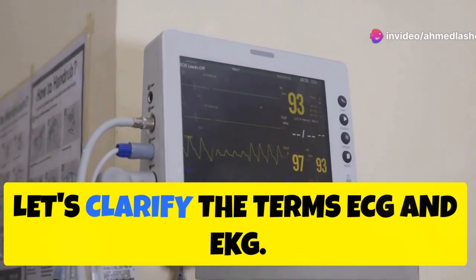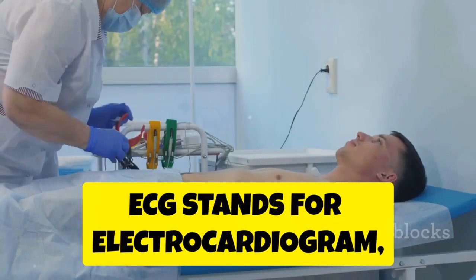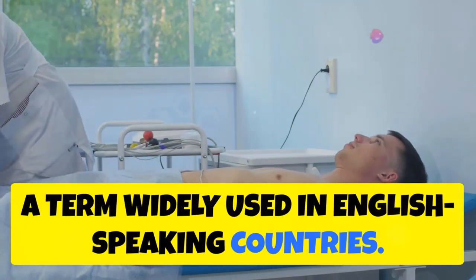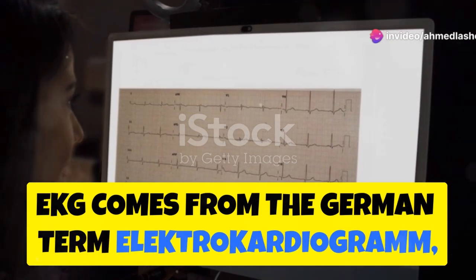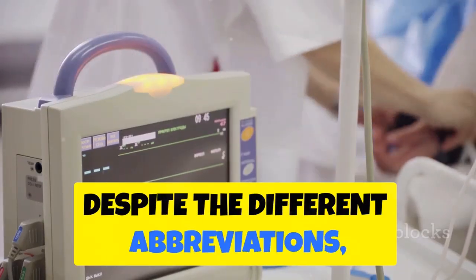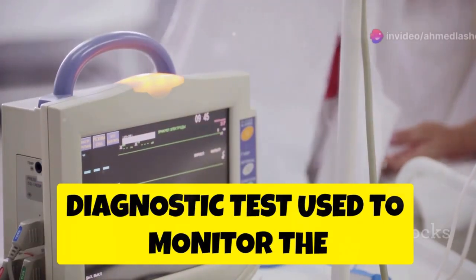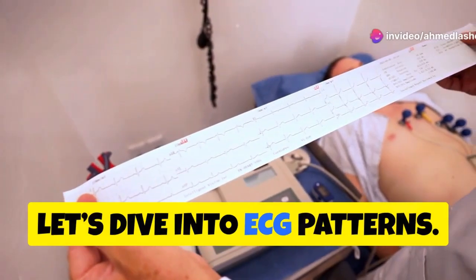First, let's clarify the terms ECG and EKG. ECG stands for electrocardiogram, a term widely used in English-speaking countries. On the other hand, EKG comes from the German term elektrokardiogramm, named after cardiologist Wilhelm Einthoven, who pioneered this technique. Despite the different abbreviations, both ECG and EKG refer to the same diagnostic test used to monitor the heart's electrical activity. Now let's dive into ECG patterns.